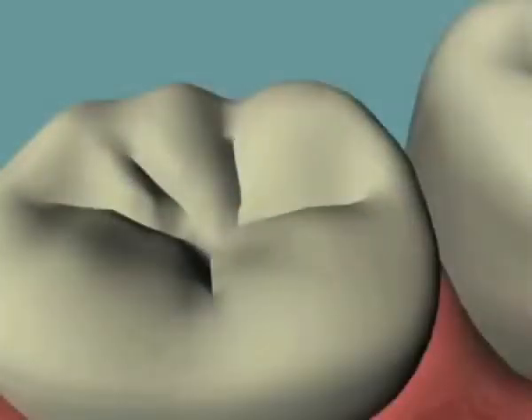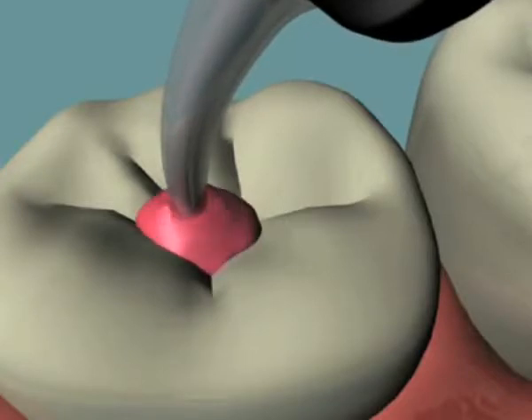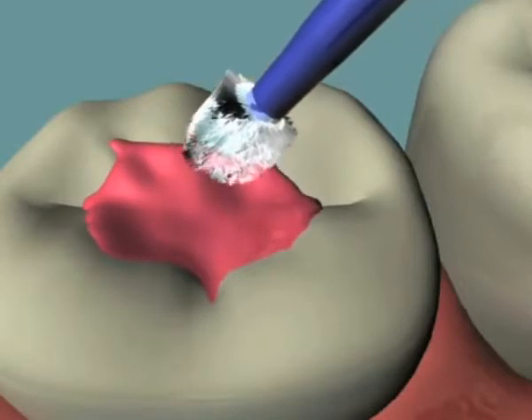The many benefits offered by glass ionomer technologies have led to the development of low-viscosity cements, which are applied to tooth surfaces like a varnish, offering a long-term protective coating for surfaces at risk.